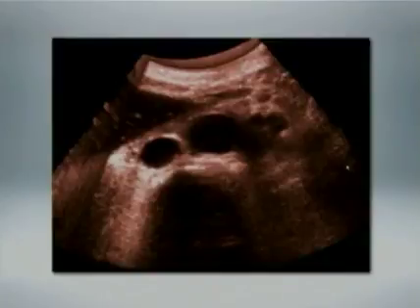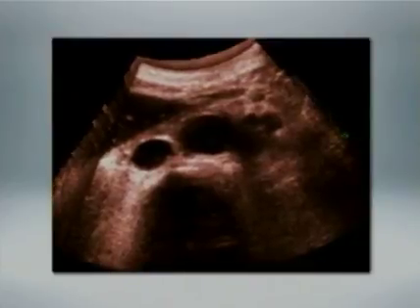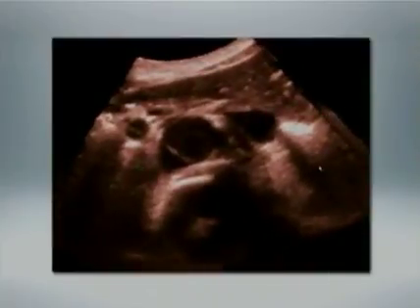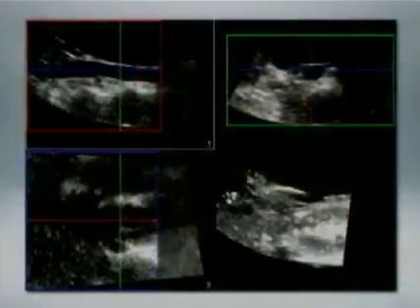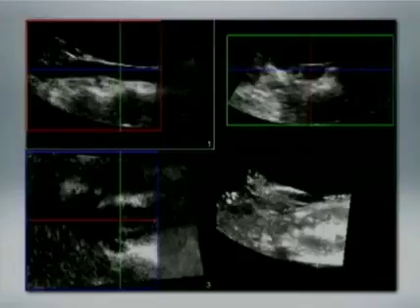So far that's been impossible to do with the older style transducers, but again that doesn't mean that in ideal situations we couldn't get good volumetric images with those probes. Here, for example, in a 5-year-old sequence is a 3D reconstruction of the aorta and IVC, and as I turn this volume around you can see that there is a dissection flap in the aorta and the SMA. This is looking at it from the opposite direction. But generally speaking, all other things being equal, the older types of probes had less resolution than we would like. They were certainly not isotropic.